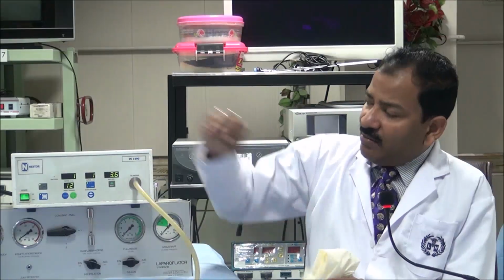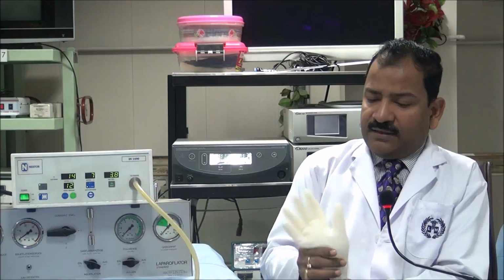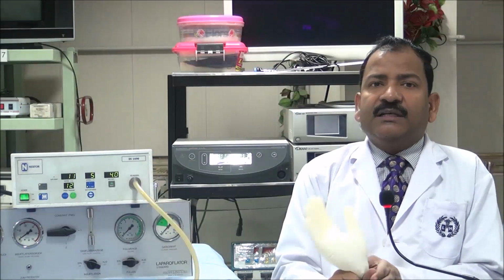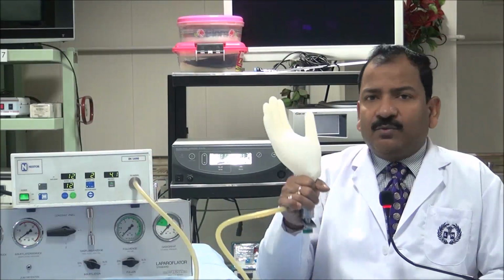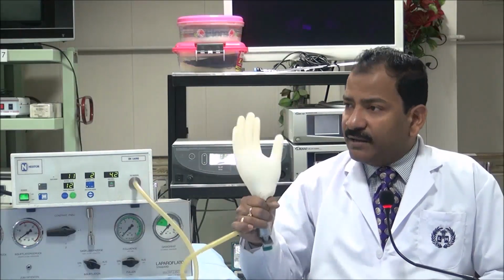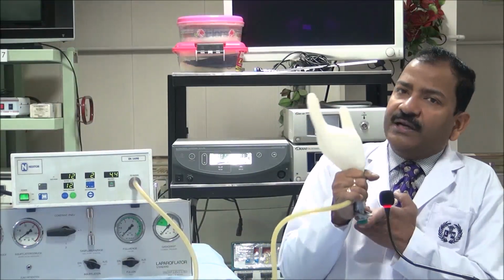So in the cannula mode, you will switch it to the 0 to max. Now it is 0 to max. Means this is cannula mode. And now the insufflator is ready to push the gas according to demand, according to requirement. Now it is no more 1 liter.